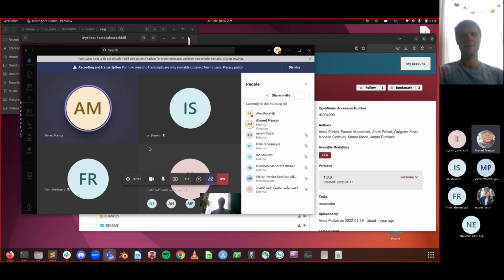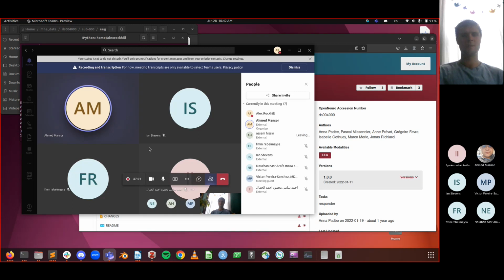Dr. Alex, I have a question to confirm. We are doing these steps for each separate patient, and then we are repeating this for each patient in our cohort. Yeah, you'd want to loop over all the BIDS paths to do it for every patient. Okay, it's very clear.